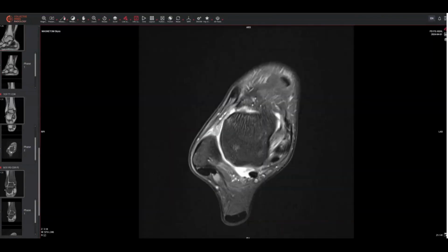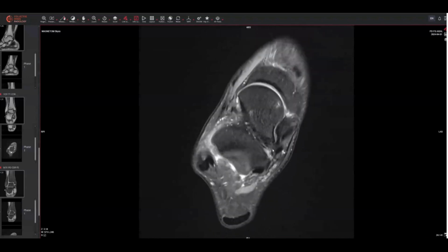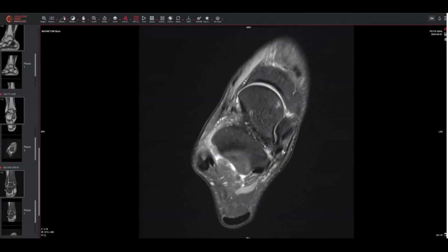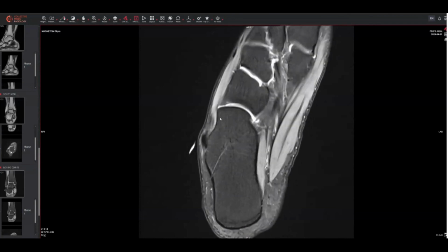our pronated moment. So when we heel strike in this patient, because of the restricted range of motion that's potentially occurring in this location from the functional fibrous coalition, as evidenced by some of the soft tissue abnormalities that are overworking in this area, we can appreciate that we then have to have a strong pronated moment.